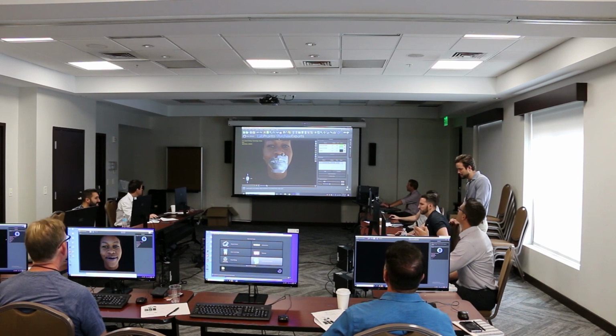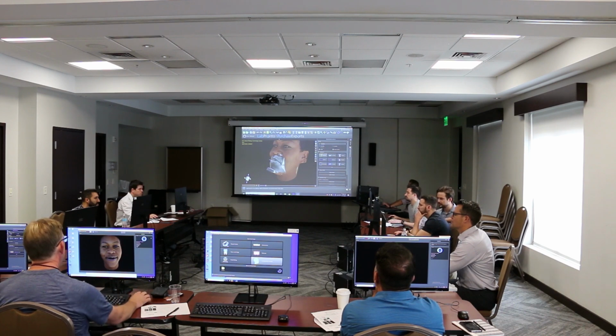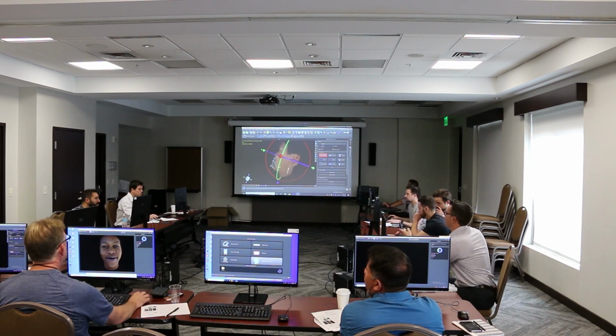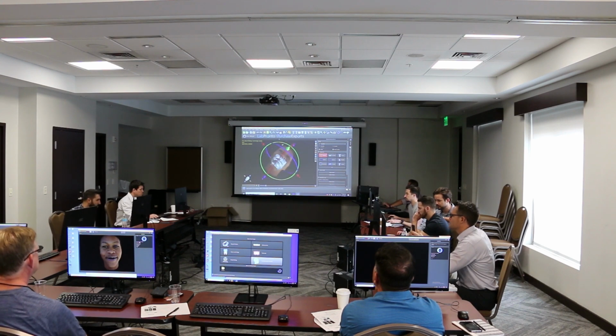So when we turn on the skin here on this DICOM data, we can now see it's a little bit off. And this is where you guys will have more of an advantage when you have more skin in your bigger field of view. But we can now go into model manipulation, and I can manually manipulate this model to fit the skin a little bit better. And this is just where you can play with the face scan a little bit and try to line up.